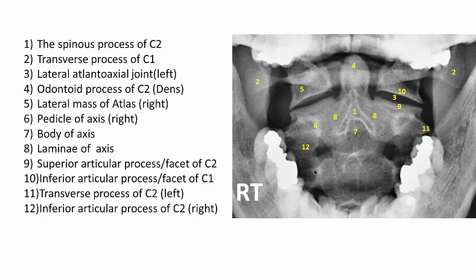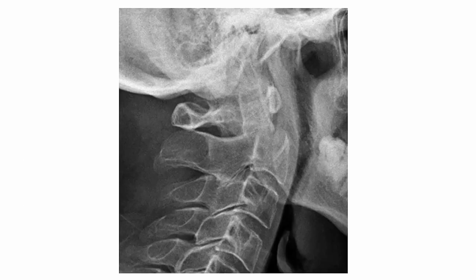Alright, take a look at that. Let me give you 10 seconds to look at that. Hope you saw it. This is your 4 o'clock, or this is your 5 o'clock patient coming in. Well, if you don't see it, let's go back to the foundation.